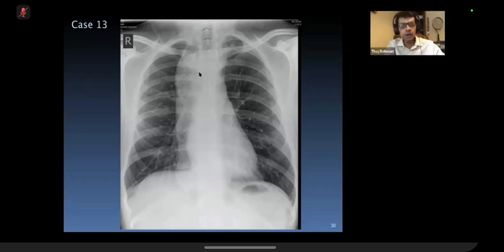That's fine, I'm just thinking out loud. This is just achalasia cardia. Young man, you know that primary achalasia usually happens in young people, and it's a dilated, distended esophagus. Stomach air bubble is in its normal position. Yeah, good.